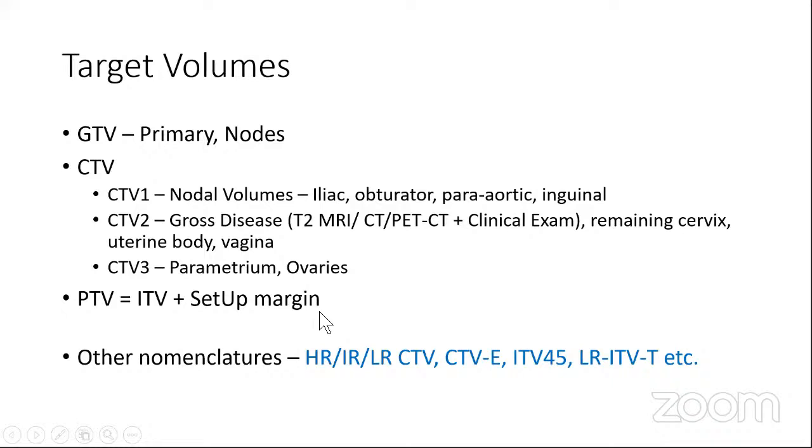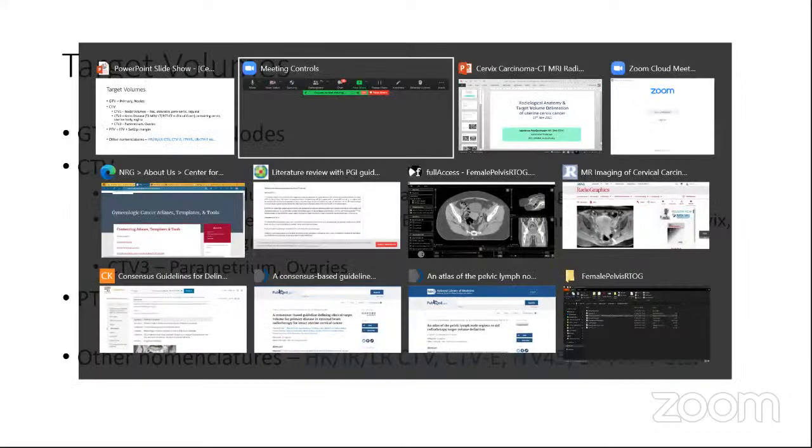So I think rather than discussing much about the theory part of it, let me open up the software provided by the NRG, the RTOG group, which is really available. Let's go to the image and then discuss that. I'm just shifting the window.